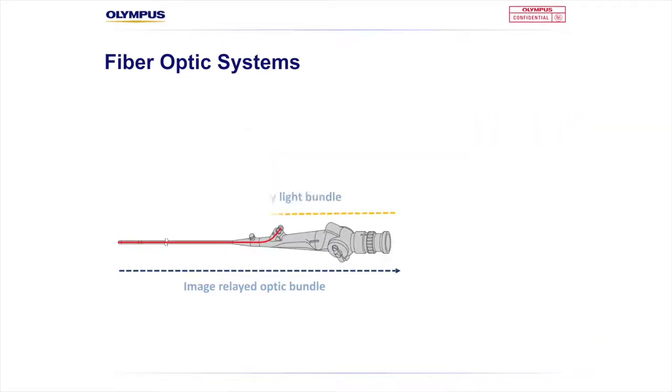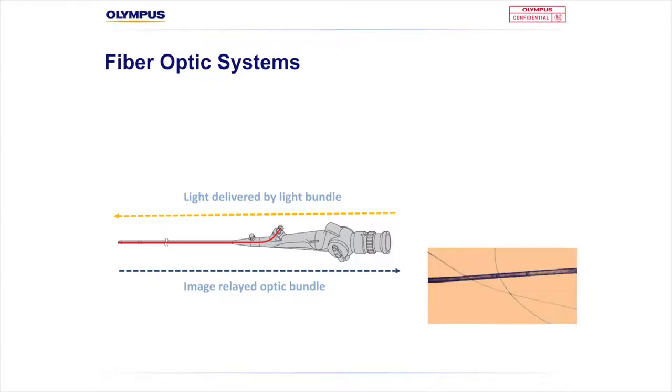In fibre optic scopes, separate to the optic bundle, there is still a light bundle to deliver light into the surgical field. Each fibre in both the optic bundle and the light bundle of a fibroscope is made of specialised coated glass. Each tiny glass fibre is about 1/10 of the size of a strand of human hair. The glass fibres have to be thin like this so that they can be flexible and minimise trauma to the patient mucosa. But of course, these tiny glass fibres are fragile and will break with time of scope use and if twisting, excessive bending or pressure is applied to the tube.